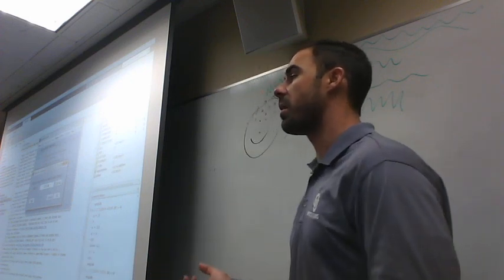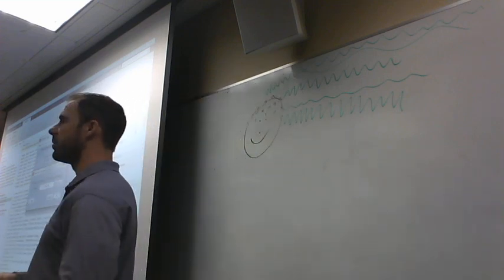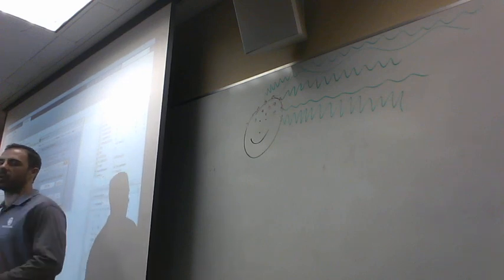So anyways, we have our average reference electrodes, 33, 34, and we tell it to do that, and then it thinks, and it loads it in, and it asks us, what do you want to do with the new data set? Okay?